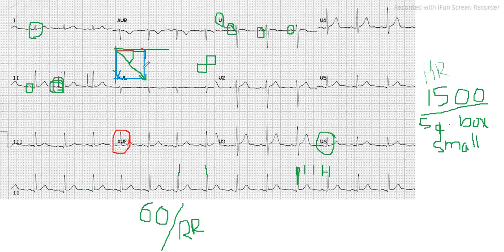So this ECG is a normal sinus rhythm ECG, the heart rate is falling in the normal range, and the axis is also falling in the normal range. In the individual waves, the T wave is also normal in morphology, the P wave is also normal in morphology, and the QRS is normal. So this seems to be a normal ECG. This conclusion can be made from here.